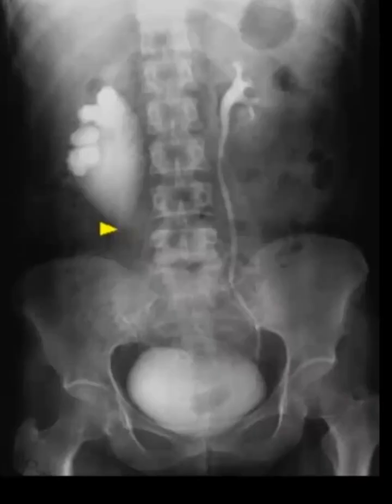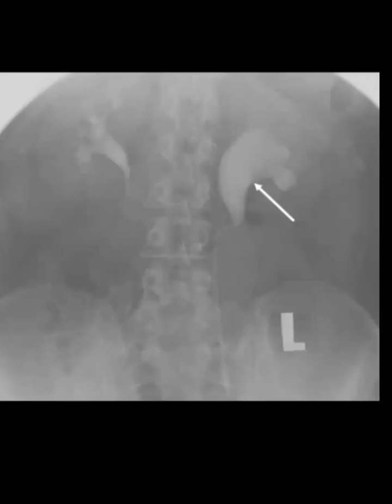Again here, what is the problem here? Again, it is the same slide. A 22-year-old man who has right flank pain, particularly after fluid intake. It is abrupt narrowing at the renal pelvis, and it is a PUJ obstruction on the right side. We cannot trace the ureter downstream. So what is the problem here? Anybody can tell me?